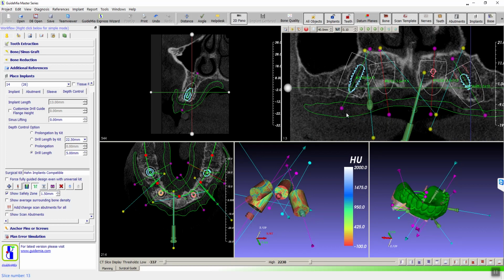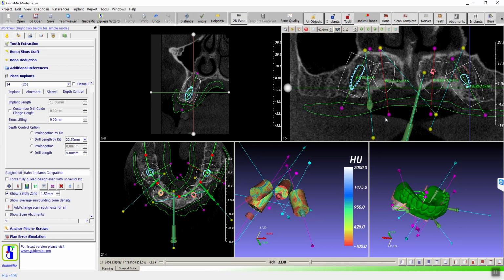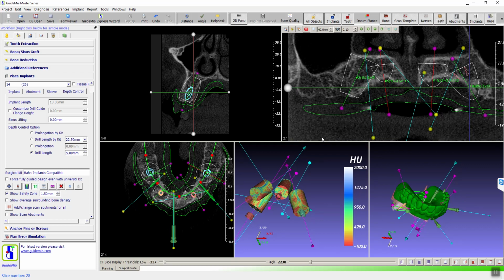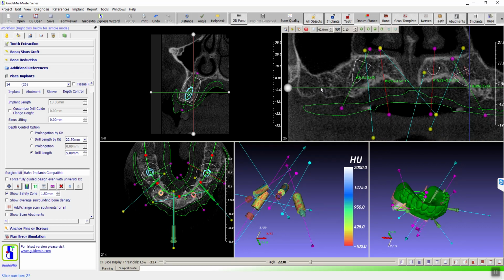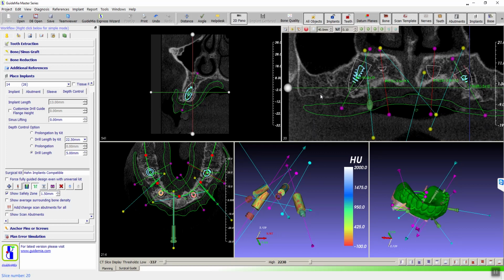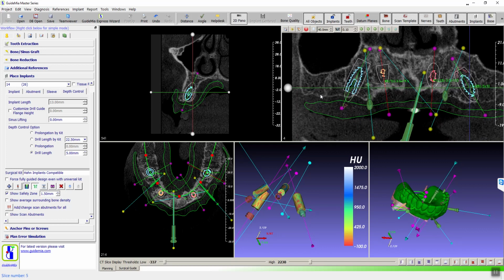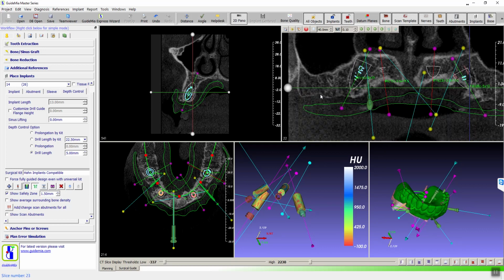And if I'm on this view, my mouse can be off the middle line. If I go further out from the middle line, it shows a bigger dynamic range. If I am in the center, it shows a smaller range. So we can do this automatically. I'm just moving my mouse there to do the inspection. It's a convenient tool when you don't want to scroll through the slices one by one. This helps you to look at that.